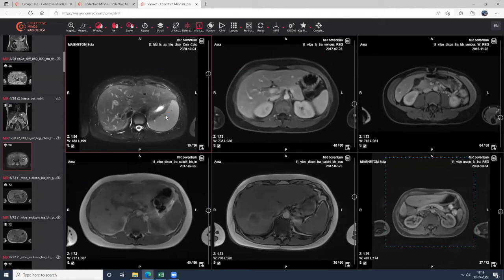I did ask my colleague of the anatomopathology department, can you give me a few cases of proven adenoma, so that I could have some cases for you, but no, I have no further detail on that. In this case, I would still think more of an HCC than of a steatotic adenoma. That would really be what I prefer for diagnosis.